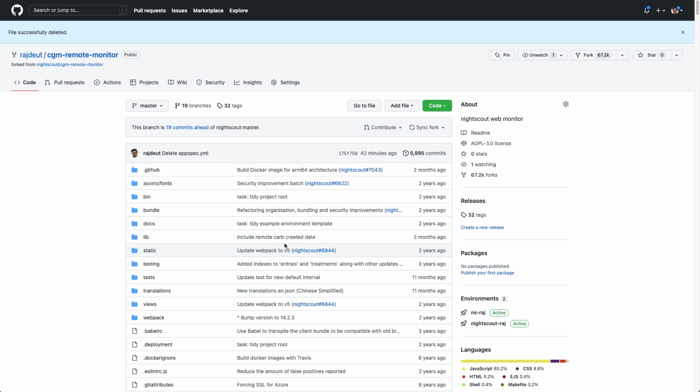What we need to do is add a very special file that Amazon needs that explains to it how to deploy or apply the Nightscout code to the infrastructure that we're about to create. In the past, Nightscout has had versions of this file for different platforms. I think they did it for Azure, but they don't do it for AWS. They may change that in the future, I don't know. But for all purposes, we need to create that file.